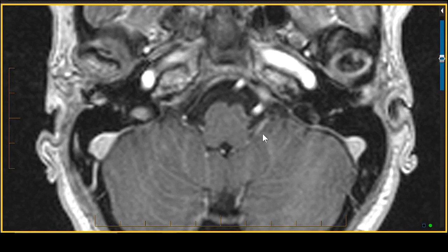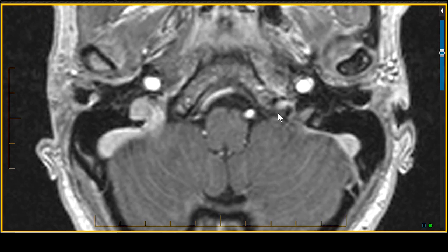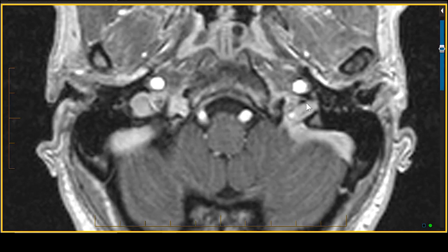Dr. P here. I want to talk to you about the descent of the vagus nerve. Now here's the vagus and glossopharyngeal nerve. As we work our way down, you can see the nerves crossing anterolateral, and you're going to follow them into a space right between the internal carotid artery and the jugular vein.